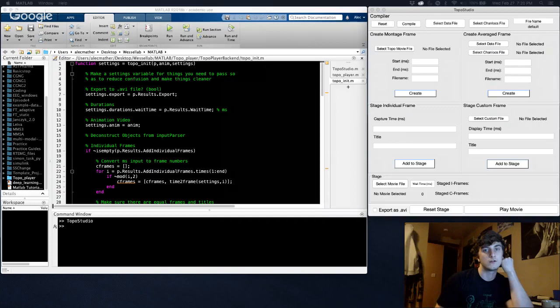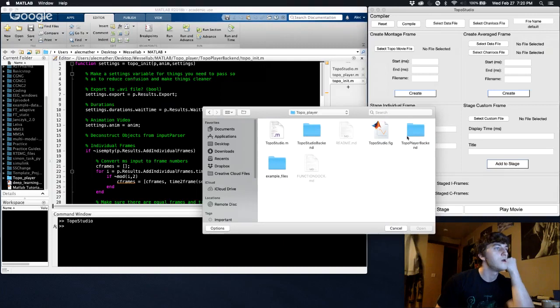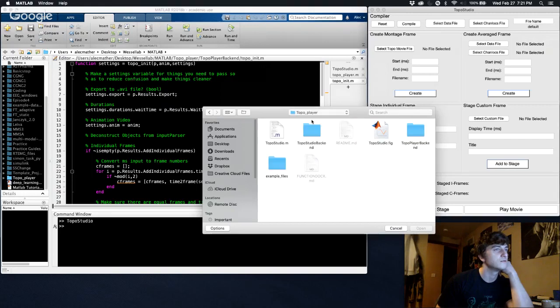So I'll pull this up. I'm just looking for a file. Hold on. We created a movie recently, and what was the last one that I made? Is it Real Test Movie?